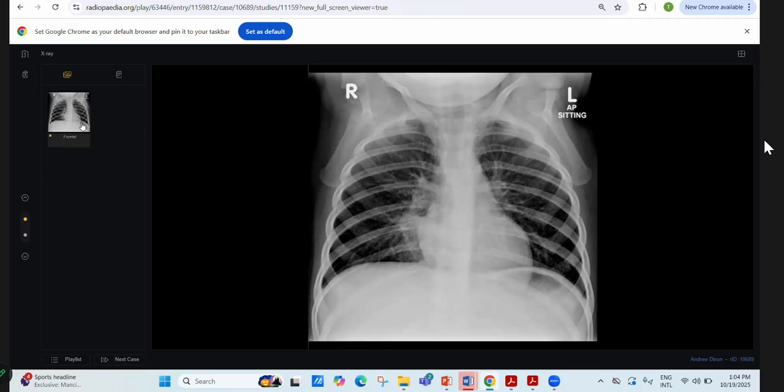This is the X-ray chest frontal projection of a skeletally immature patient, in which I can see that there is a generalized increase in the bone density, and I can see the clavicles as well. No definite lesion is seen within the lung parenchyma. CP angles are clear.